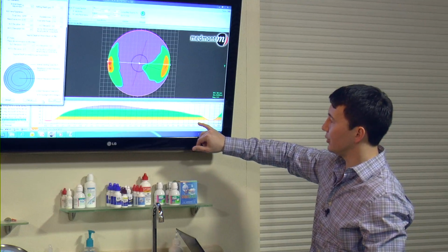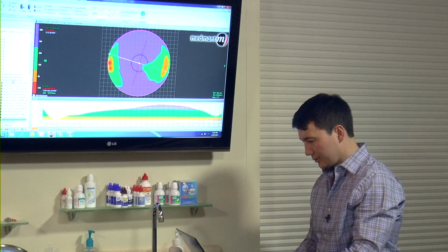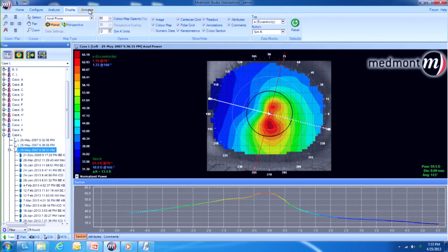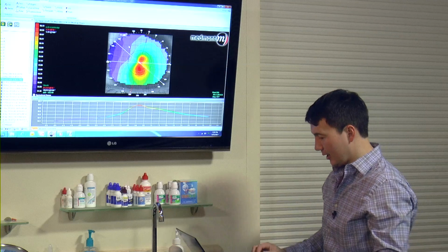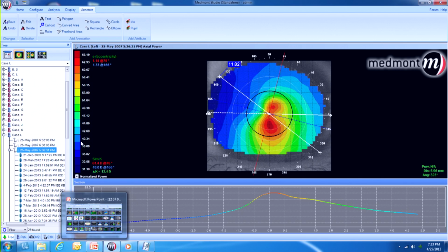And this patient, let's actually measure, just so we're 100% sure what the visible iris diameter is. So let's run a ruler across this visible iris, and we ignore the colorized map and find that white, gray, or white iris border, this white to white measurement. And this eye comes up as 11.8 visible iris diameter, absolutely right in the middle of the bell curve diameter.